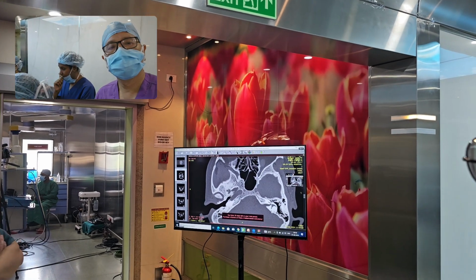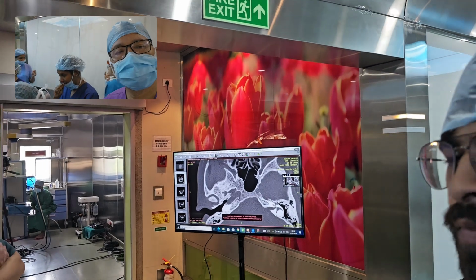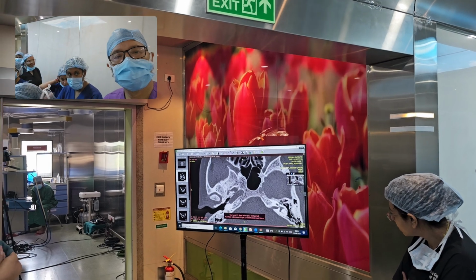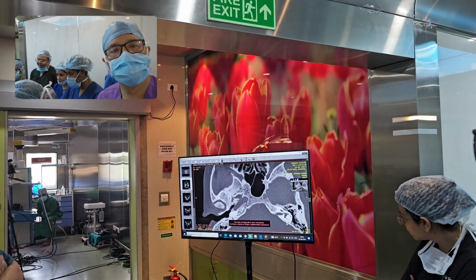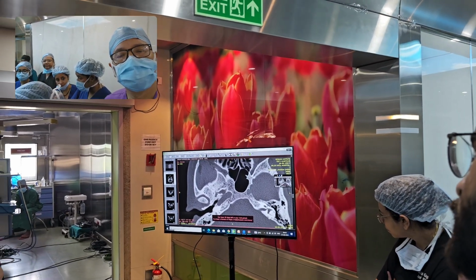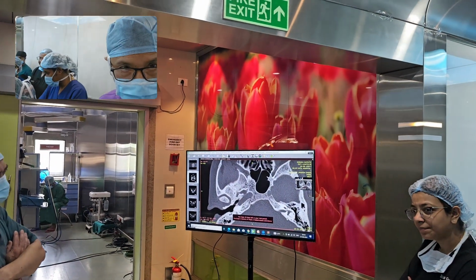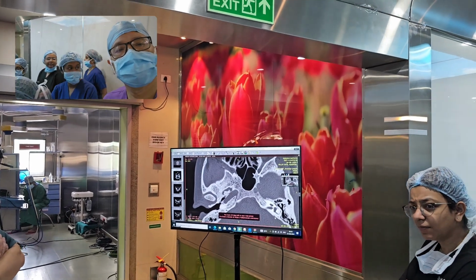Then the vestibular aqueduct. You saw in this section yesterday the vestibular aqueduct. See where the vestibular aqueduct is. This is the vestibule, from where this very thin, J-shaped aqueduct goes and opens at the posterior petrous ridge. This is the endolymphatic duct system. If it is dilated, you have to be suspicious about it. If not a gusher, it can lead to an oozer.